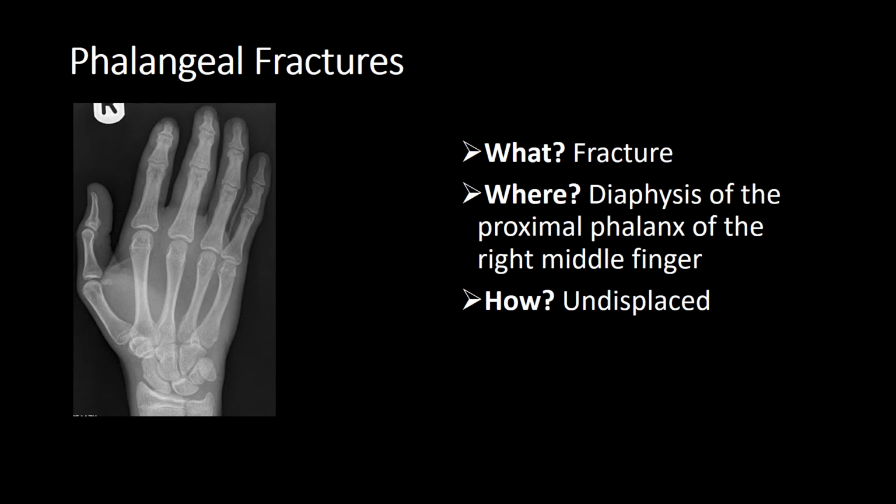So what is it? It's a fracture of the diaphysis of the proximal phalanx of the right middle finger. How? It's undisplaced.